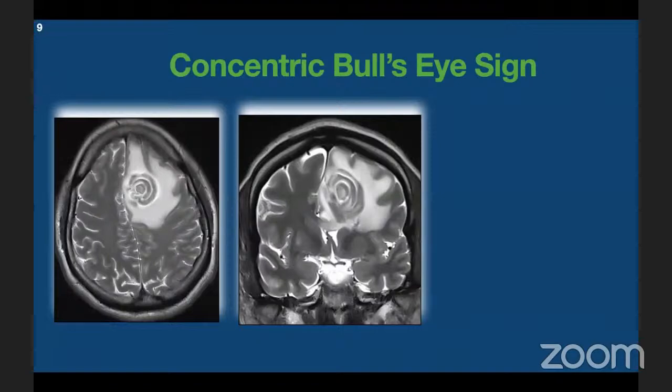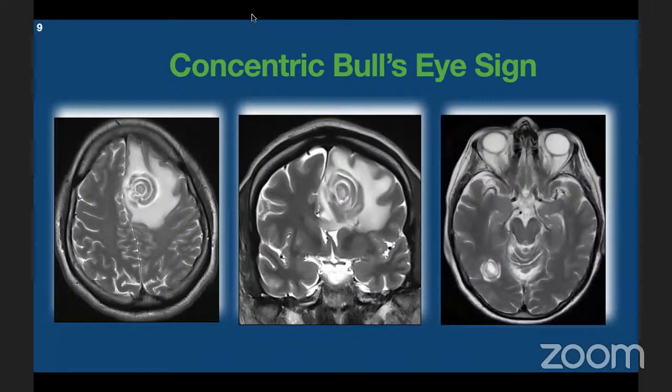In cerebral toxoplasmosis, once in a while, the bullseye can also have a concentric appearance. And when the lesions are concentric, it is difficult to differentiate from concentric lesions of Balo, that is, Balo's concentric demyelination. However, with the bullseye sign in cerebral toxoplasmosis, there is marked perilesional edema, as you can see here. In Balo's concentric sclerosis, on the other hand, there is no significant perilesional edema.